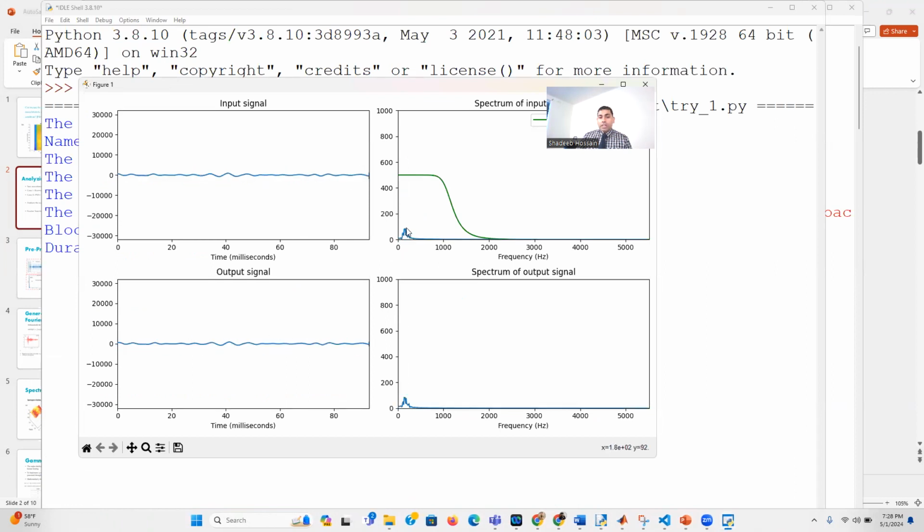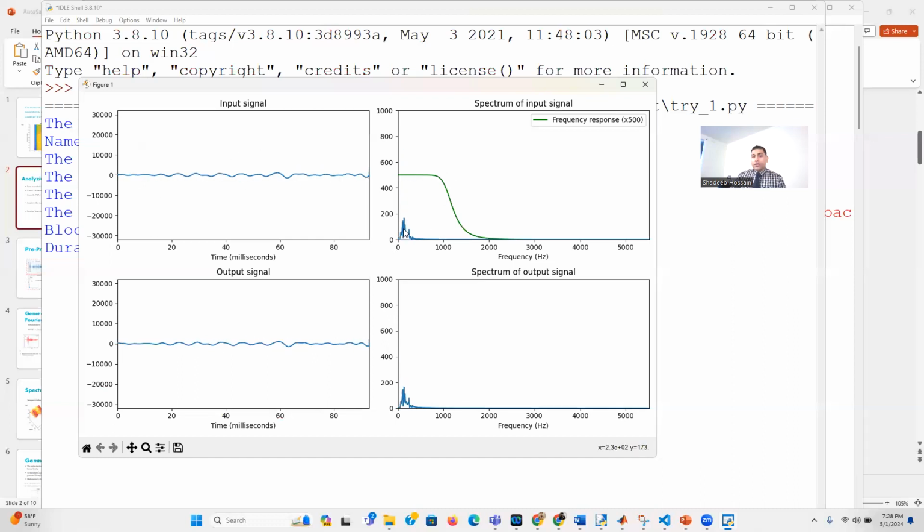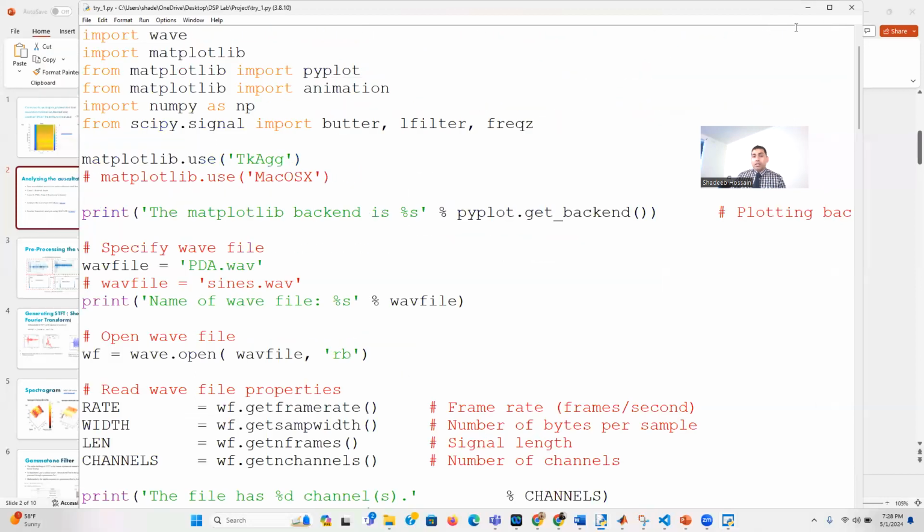You could see over here, it is generating a real-time spectrum. Okay, this is the input signal and this is the frequency spectrum. You would be able to see it, and the same thing can be applied for a normal heart.